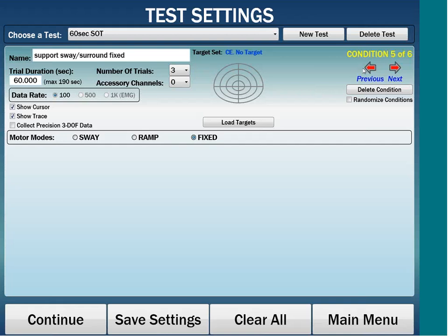That, I think, covers the exporting functionality. One other last thing that I would like to cover is when you exit into the main screen, we'll go ahead and navigate to the settings. The setting of use multi-group database, directory database management allows you to separate your research population between different projects, different departments in school, in clinics, and it's very, very helpful. No one will add data to a patient in your study.